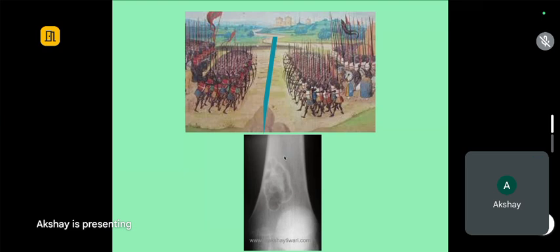So, a narrow zone of transition is when abruptly bone stops and disease starts. This is generally 1 millimeter or so. So if it's 1 to 2 millimeter, you call it a narrow zone of transition. Now that narrow zone can also have a sclerotic margin or can be without a sclerotic margin, right?